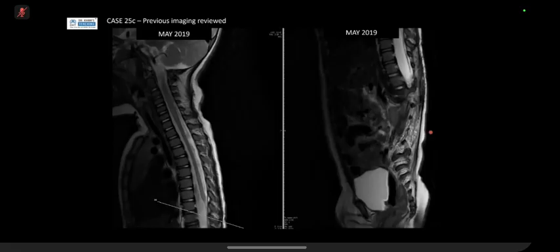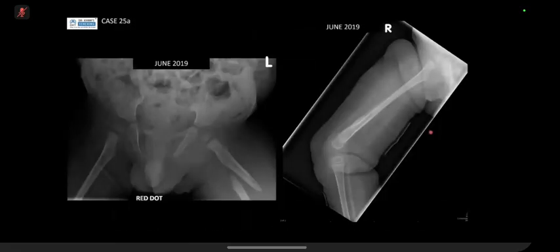So are you still going with pathological fractures? Sorry, it's a difficult case. Essentially, what I was just trying to show you was on the line of insufficiency fractures. I like the fact that you thought, so let's go back to what you said. There is no metaphyseal lesion here. Yes, there's a little bit of irregularity here.